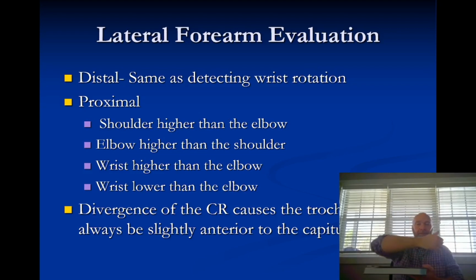If you don't get the patient down to where the shoulder, the elbow, and the wrist are all in the same plane, then you might have this dipping kind of thing going on too. Remember, what we're talking about are the condyles of the humerus. With the humerus, that's distal and this is proximal.